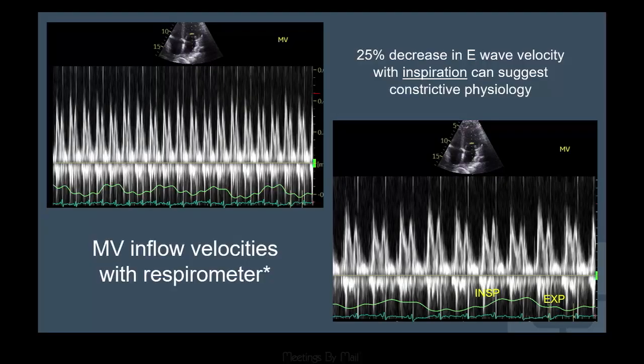Pardon me? A normal one would be like an 8 to 10 ratio, but this is 2.9, very, very low. In other words, the E prime is so disproportionately high, and therefore the ratio is low. Lateral is the two extremes, the lateral mitral annulus and the tricuspid annulus should be the most.